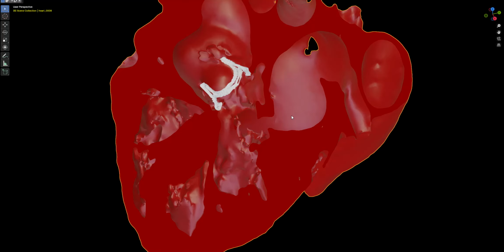This is Dr. Bramlett. This is case 4D0035. What we have here is just to orient, a 3-chamber view, and this is where the aortic valve has been placed. As I understand it, there was LVOT narrowing, and so there was an attempt to enlarge the LVOT with a patch.